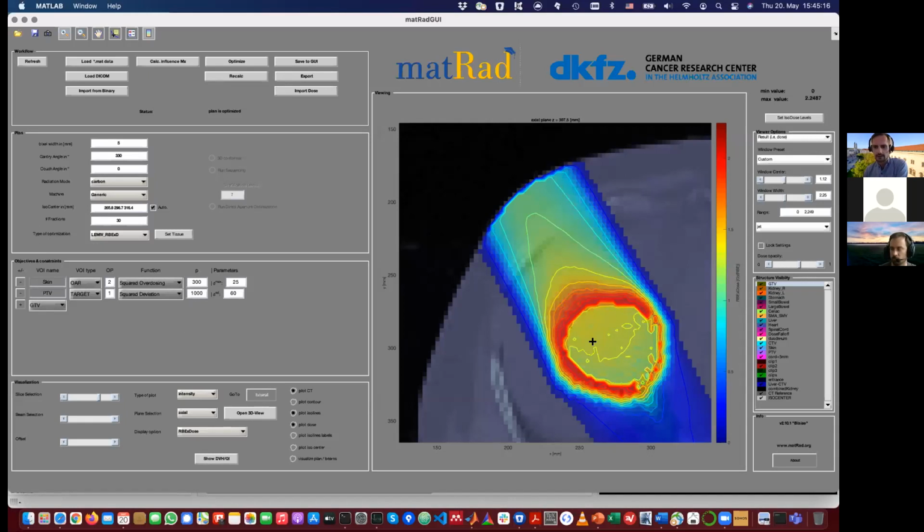And yeah, this exercise is basically to illustrate how these different tissue types impact the RBE weighted dose, how drastic this impact is, and how important it is that one accurately knows these radiosensitivity parameters. And please also here take a screenshot.